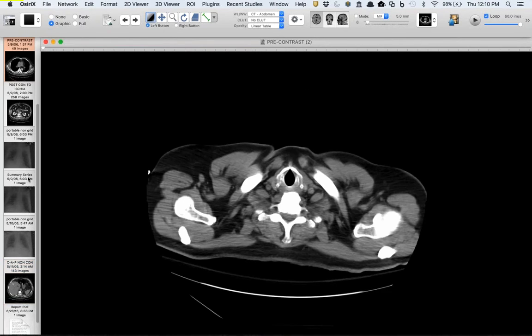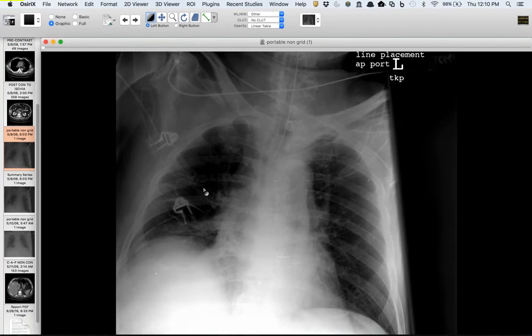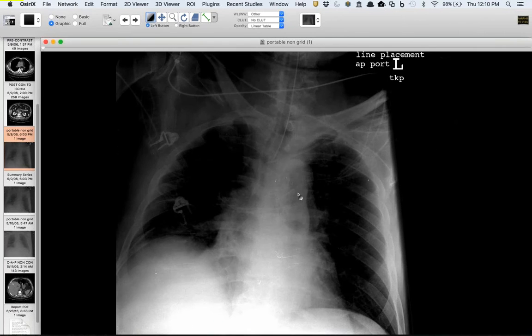Sure. And then the radiographs, you can see a little bit. Prospectively, I'd never know. I would think more that this looks almost like it's lucent in the lumen, like there were an intra-aortic balloon pump in there. Of course, you don't see one, though. Wow. But that scout was pretty interesting.